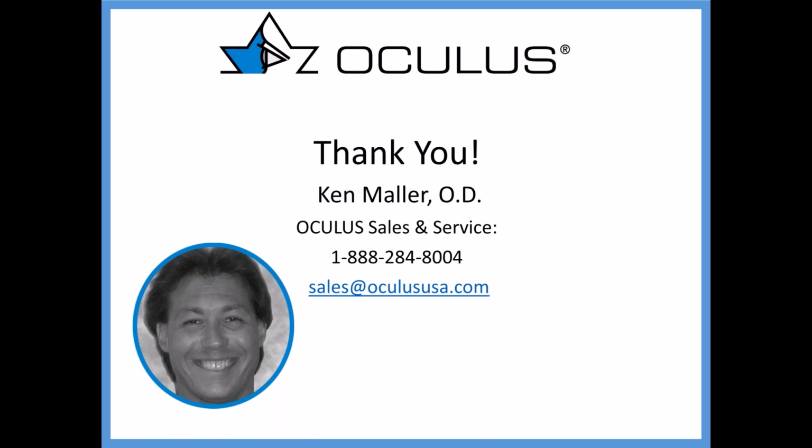And so you have to be cognizant of how large the pupil size is and how much of that sort of bundle of light you're stealing for the near function. Because the more you steal for the near function, the more they complain that the distance doesn't work, and they're thrilled about the near, but obviously it's about achieving a balance.